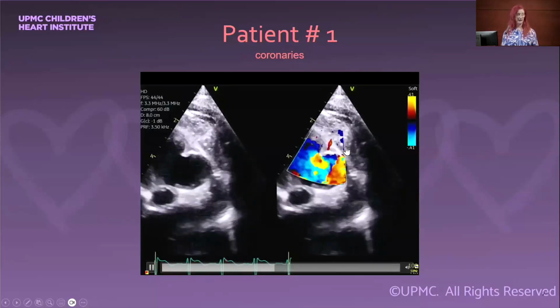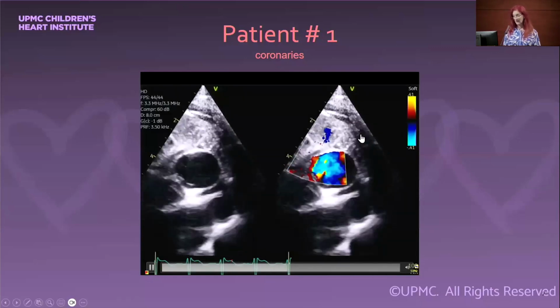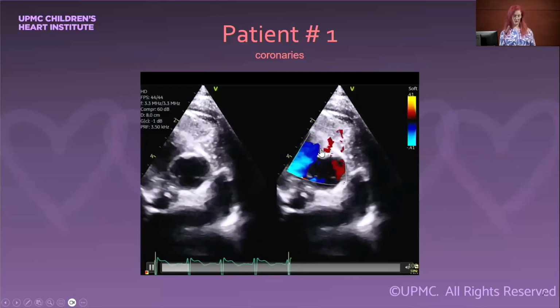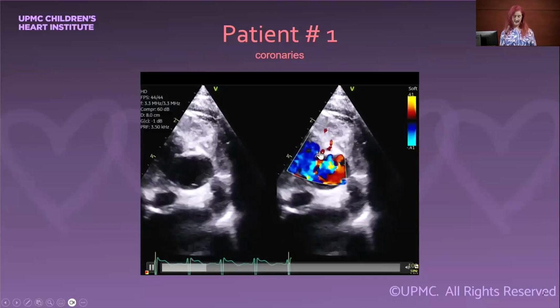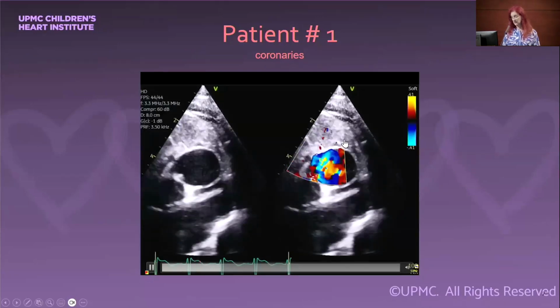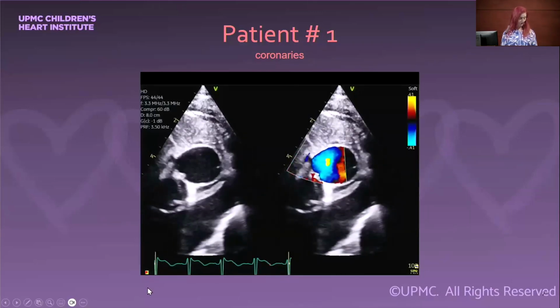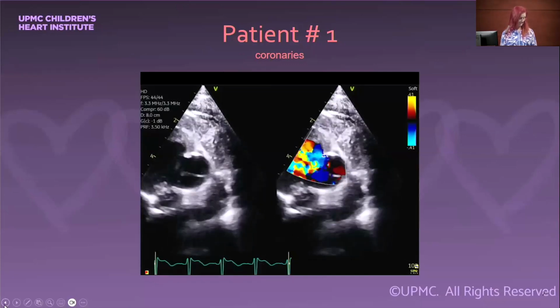There should never be a great coronary coursing over the anterior great vessel, so you know you have a coronary anomaly. And if you look, there's a branch that goes sort of superiorly on this one, but that's rightward, which will be your LAD, and there's a blue branch here, which will be your circ. So we were very suspicious that this was a single right coronary, which is not advantageous for surgeries that involve moving the aortic valve or reimplanting coronaries.